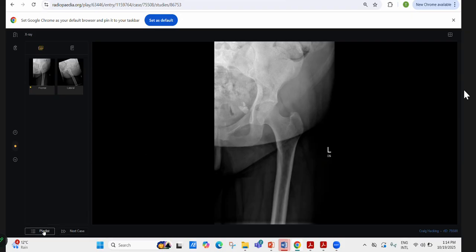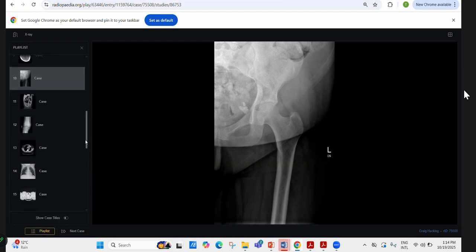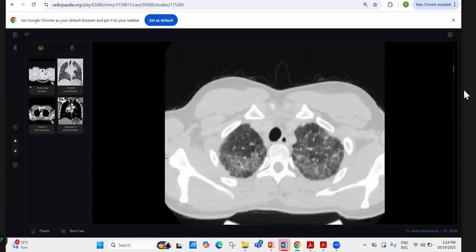Yeah. So who is candidate 4? Me, ma'am. Assalamu alaikum. Walaikum Assalam. Any questions, or we can read the chat in the end if there is any. I don't know if somebody is putting some questions in the chat. Okay, so this is your first case, and candidate 1, are you keeping the time, please? Yes, ma'am. Yeah. So this is your case. Yeah, your time starts now. Okay, ma'am. Ma'am, I have requested control.